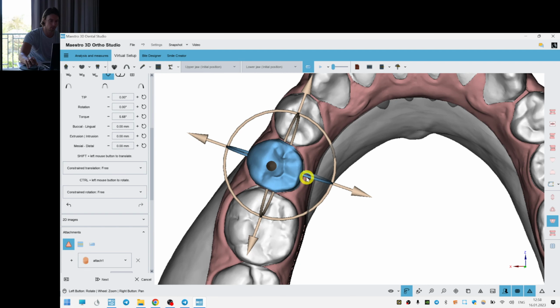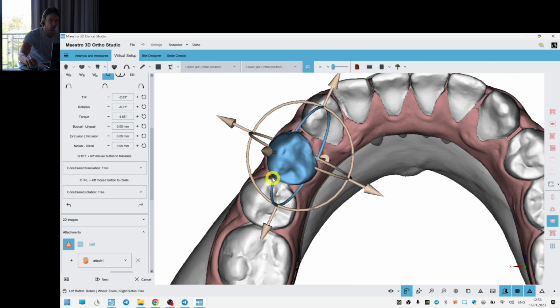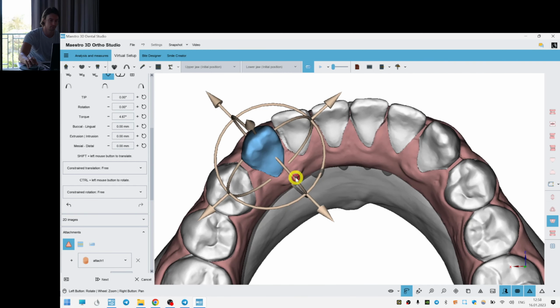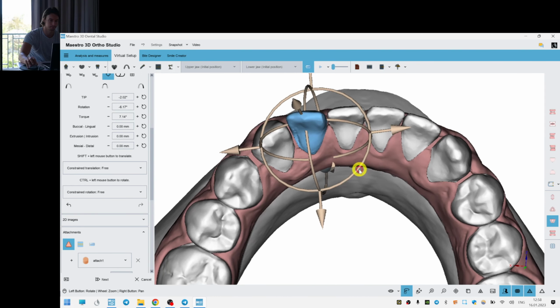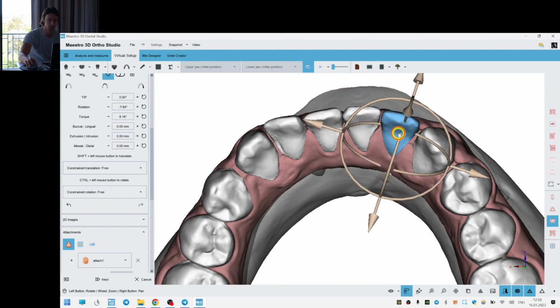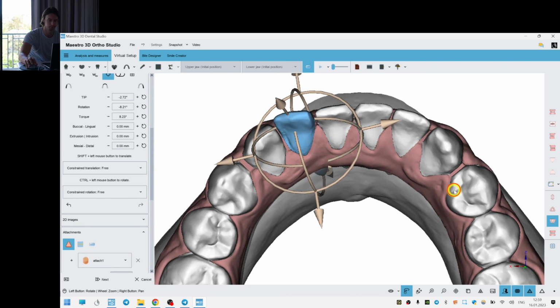We know we cannot distalize more than 2 teeth at the same time. I think it should be good for the layer 1. Let's distribute the spacings more evenly.